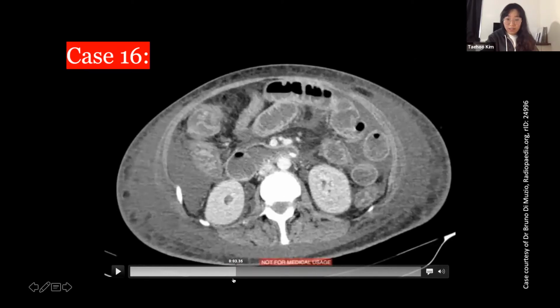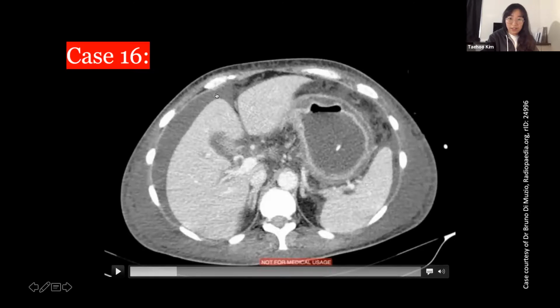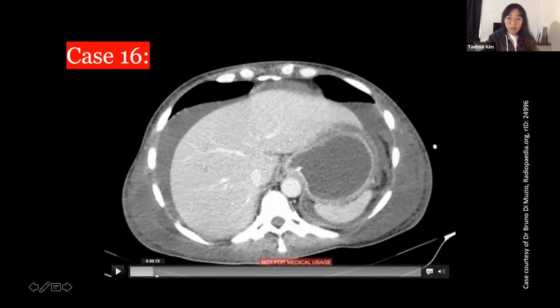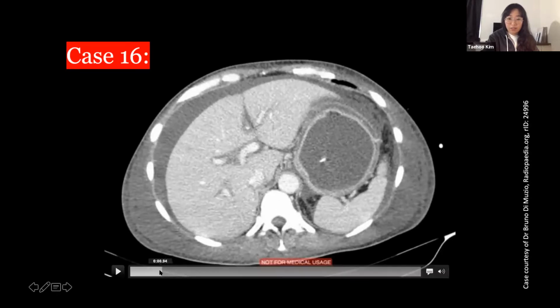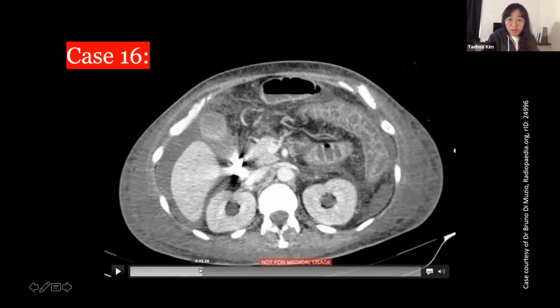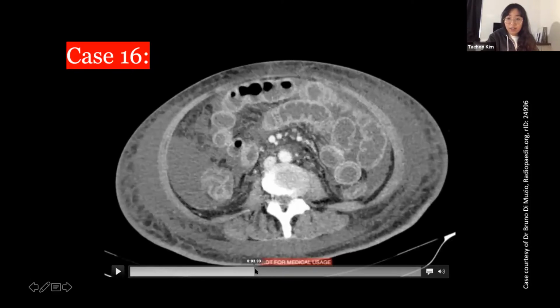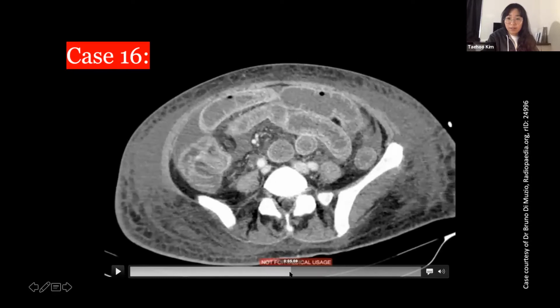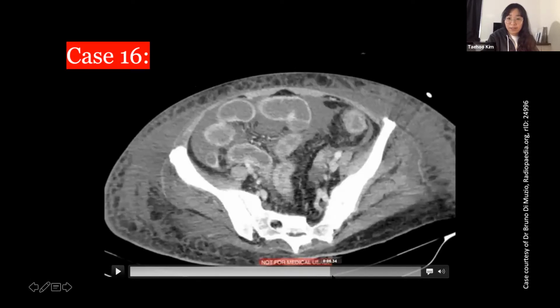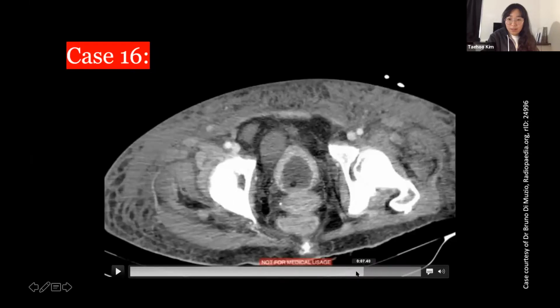On top of that, inside the abdomen, there is a lot of free fluid. I'm sure your eyes are getting used to checking for free fluid here. It's everywhere. Now, we need to find out where this is coming from. There's an NG tube, but it's in the normal position. Or maybe it's a Dobhoff, it's going further down. And then the patient has colicky abdominal pain, diarrhea. It's not COVID. Does anyone see what could be the cause of the patient's pain?